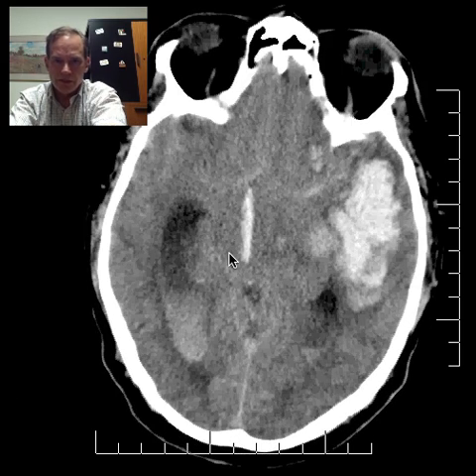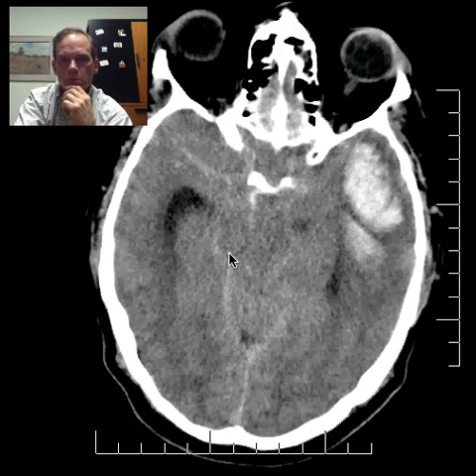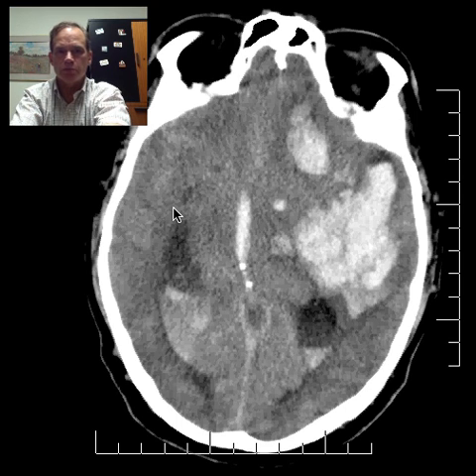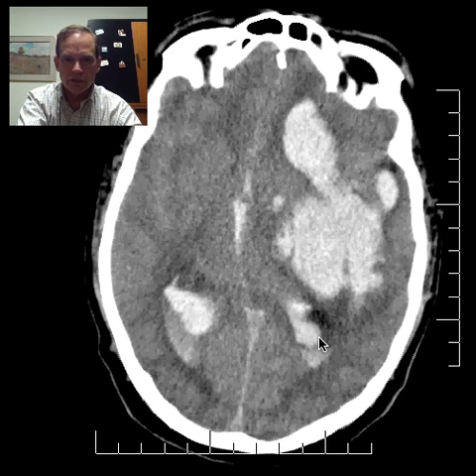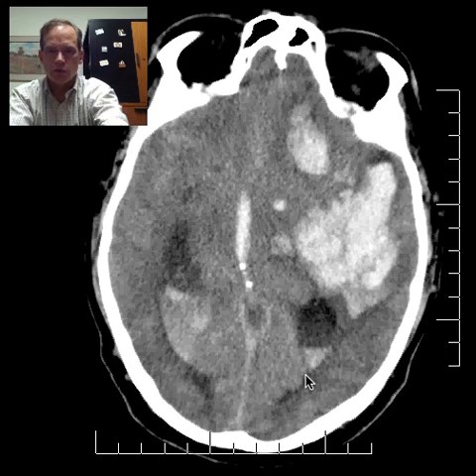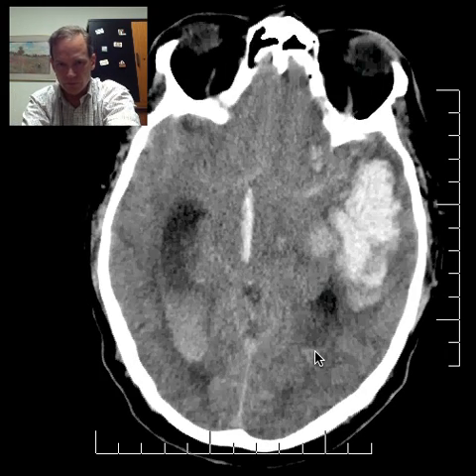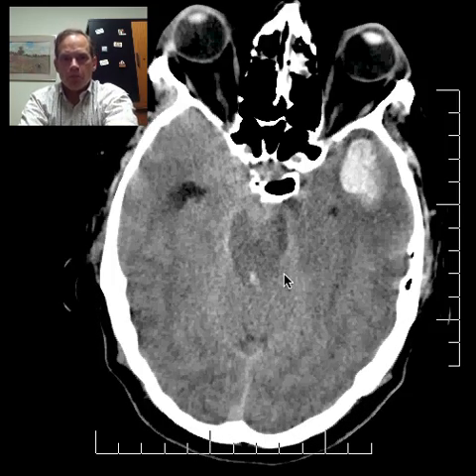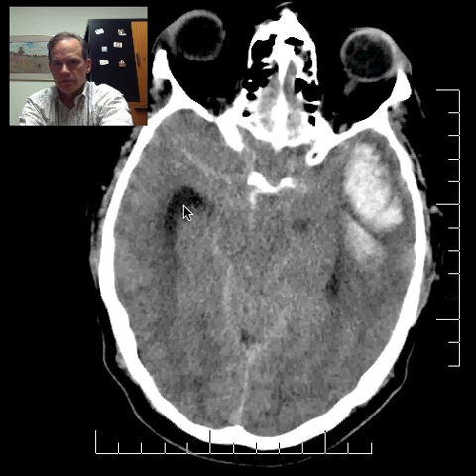But if you look down here and use your mind's eye, here we have a right lateral ventricle. This is the temporal horn of the right lateral ventricle. So if you follow it upward superiorly, you see this widening, which is the atrium of the right lateral ventricle, the atrium of the left lateral ventricle, and they ordinarily have a little thin horn, the occipital horn of the lateral ventricle, but that's not very well developed or demonstrated here. This is a little dilated.